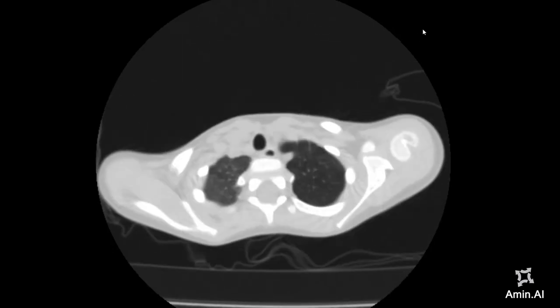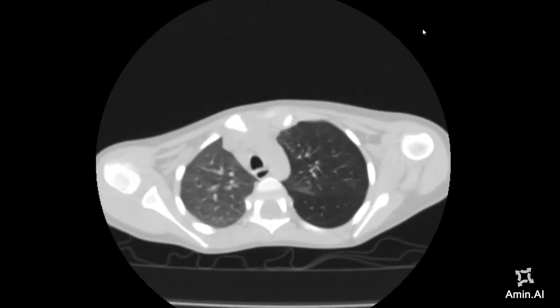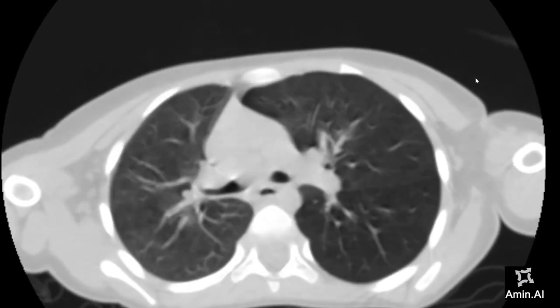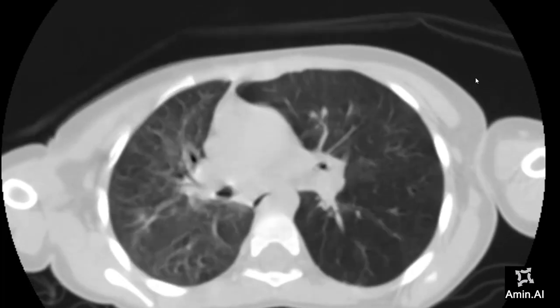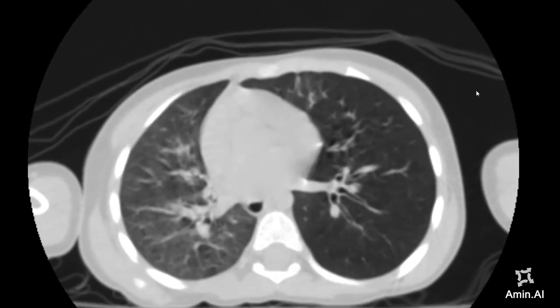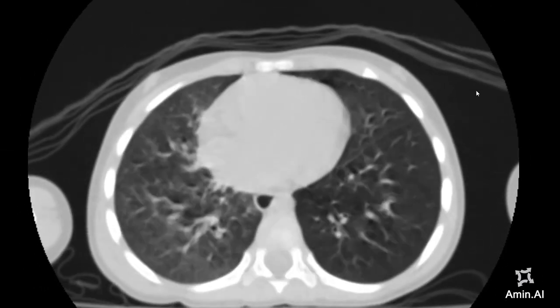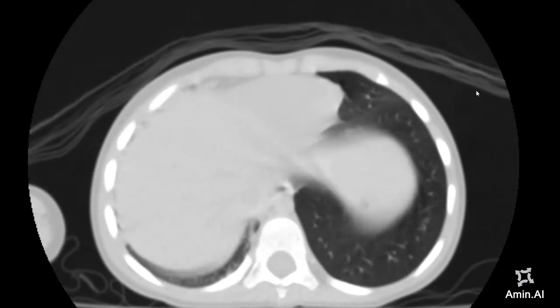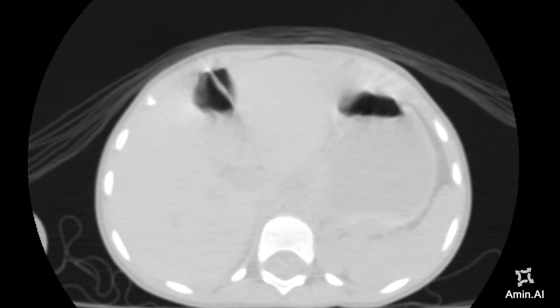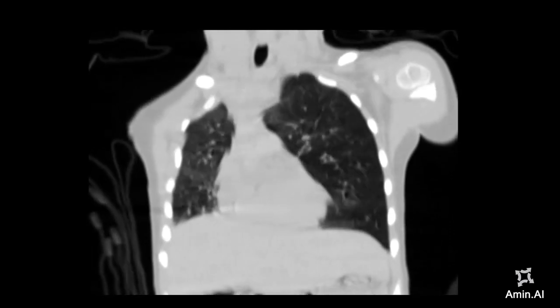And now I will browse through the images of HRCT of the same patient. And these are the coronal images of the same patient.